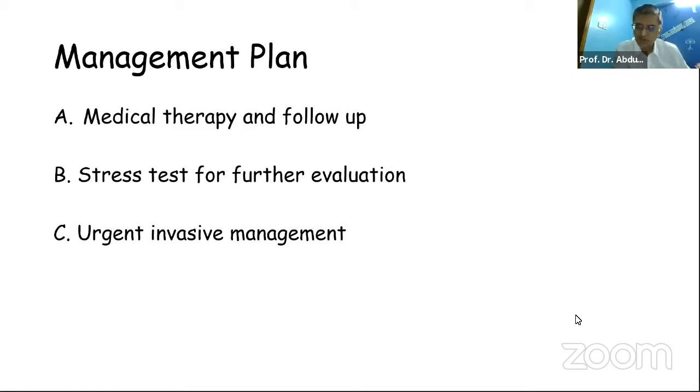Multiple risk factors, typical ischemic chest pain lasting for hours, though it may not be present now, and there is typical biphasic changes without presence of LVH. There is no LVH. There should not be any T inversion, but it's there, and it's in the mid precordial leads. All this suggests this is a very likely Wellens' syndrome.